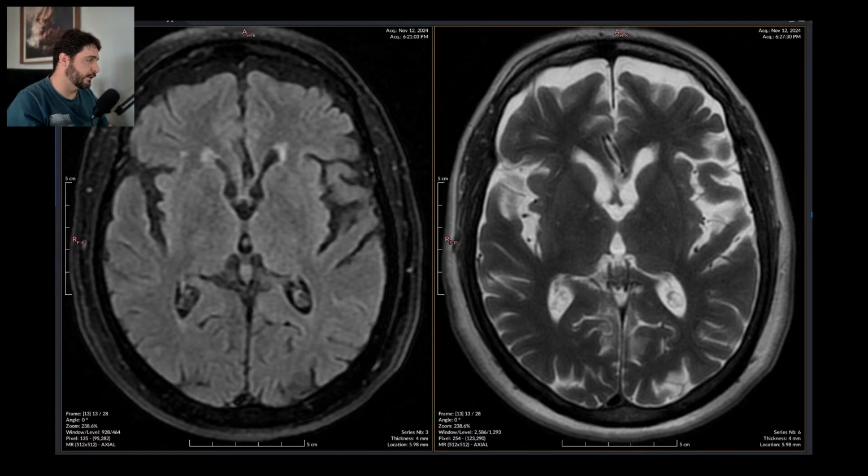Just summarizing it so we can go to the next one. Right there, we are done. Let's just finish it up right there. And let's grab another one.